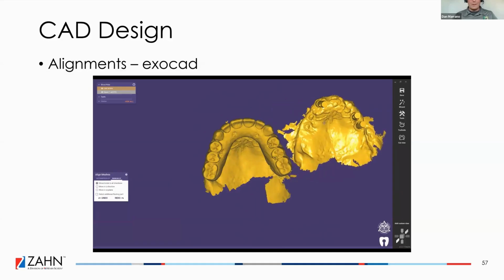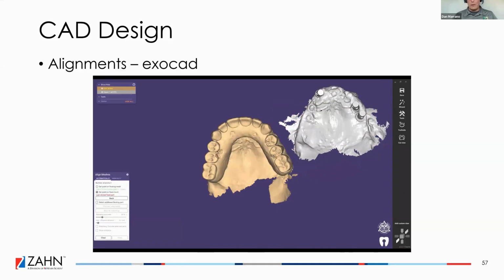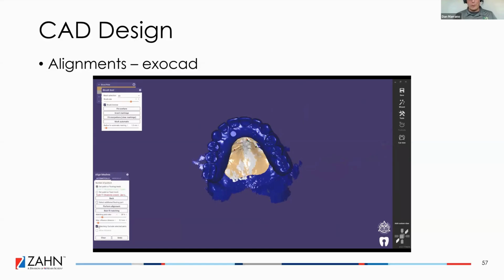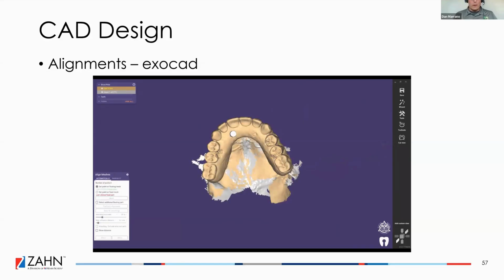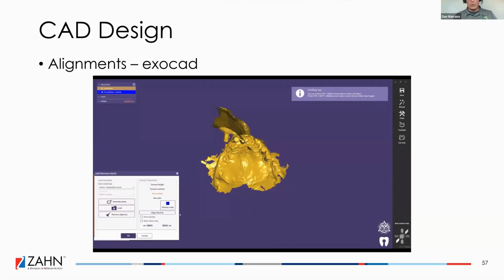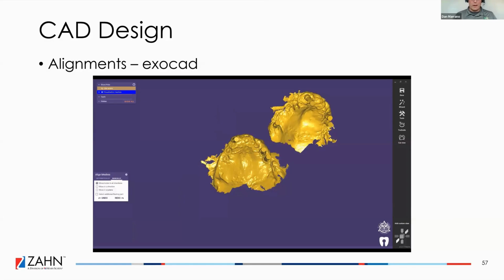But I just like this. I like the colors that you see, so you know if you have good alignment. It seems quick. I don't have to reopen the old case or a fake order or anything like that. So that is the first surgical scan to the preoperative scan.